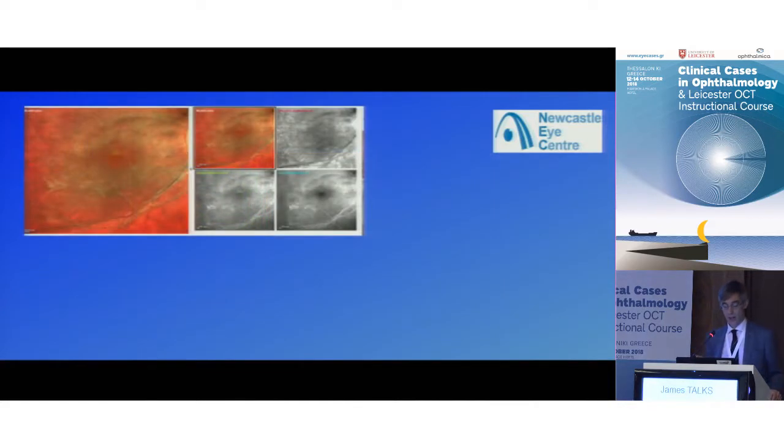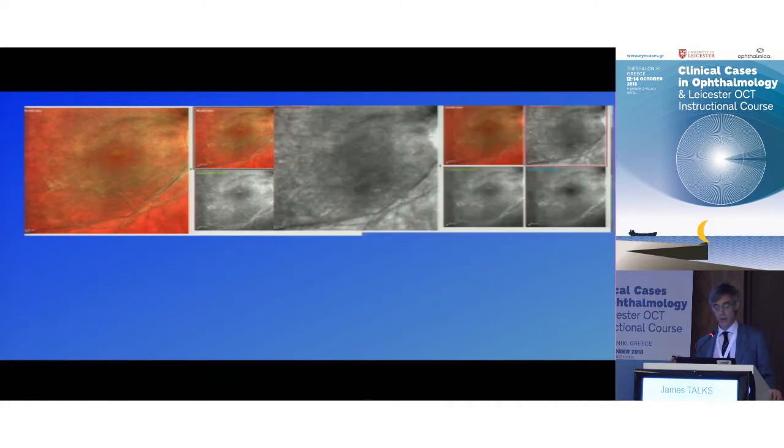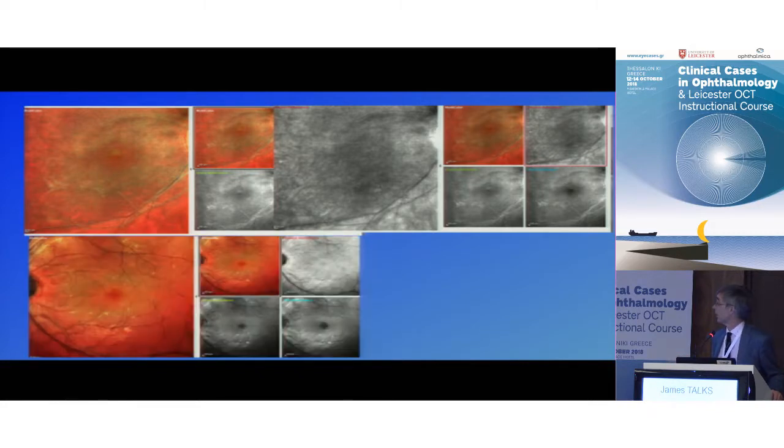If we look at the actual eye, of course, it does. You can tell the vessels, they are there, but they're thin. The whole color is wrong on the multicolor. And if you're not familiar with the multicolor, you get different channels. So you get green, blue, and infrared reflectance. That's what these are, and that's the mixture together. And the whole thing looks a bit grainy. If you compare it to the other eye, much more healthy looking multicolor, and all the layers look much more healthy.